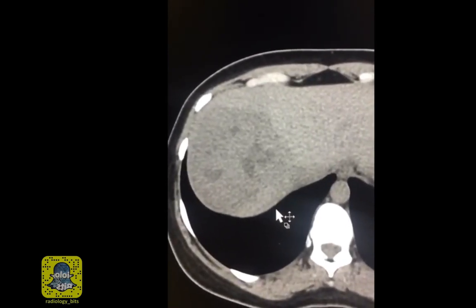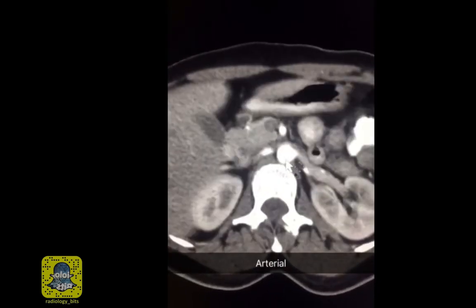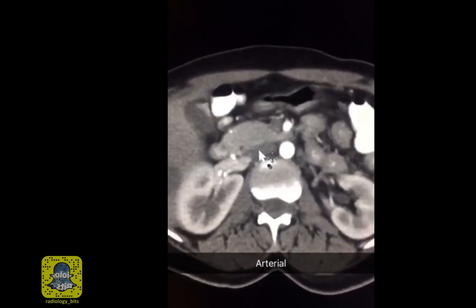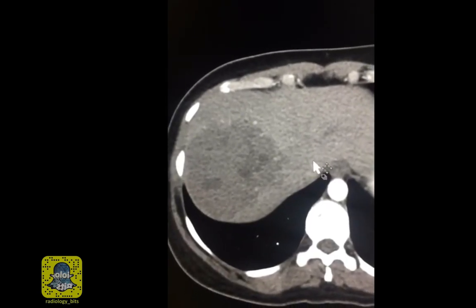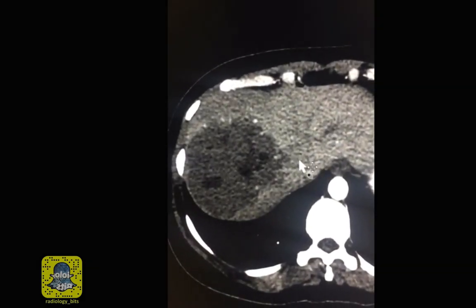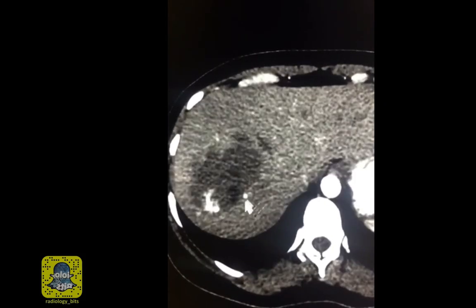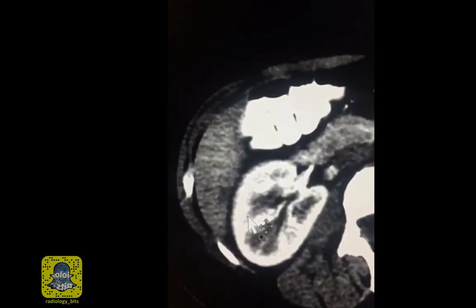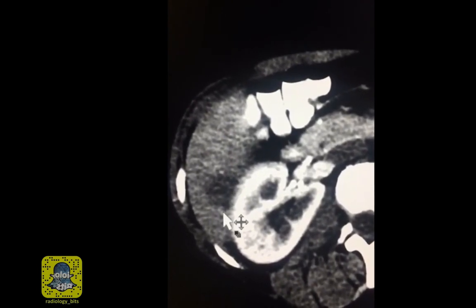We agreed that for assessing hepatic lesions you need arterial, portovenous, and delayed acquisitions. This is a phase where you have contrast that's extremely dense within the aorta and no contrast within the IVC or the portal vein, consistent with an arterial phase. On the arterial phase, we're going to look at the hepatic window to make things more obvious. And now you see that large, well-defined hypodense lesion showing peripheral nodular-like enhancement. Looking at the other lesion, you might wonder about tiny nodular peripheral enhancement as well.